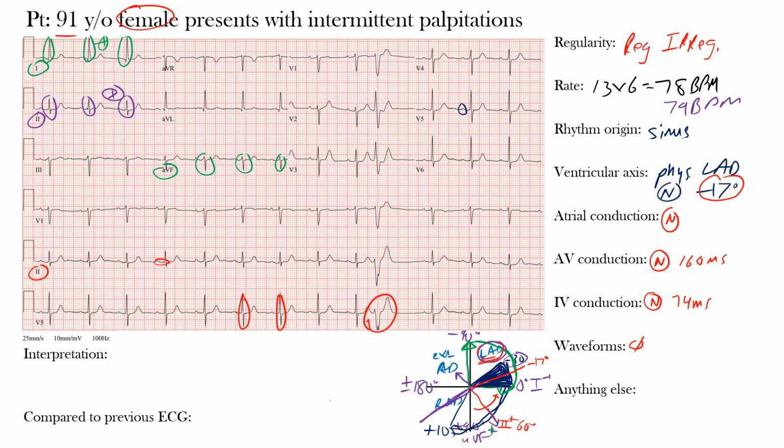Normally, R wave amplitude should progressively increase from leads V1 through V5, which is for the most part seen here. Okay, so notice that our R waves here are slowly increasing in amplitude. All right, maybe not so much from V3 to V4, but overall, we would probably consider this a normal R wave progression. Okay. Now, how about the transitional zone in the precordial leads?